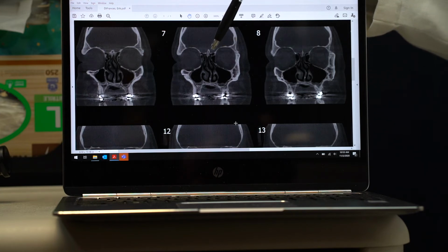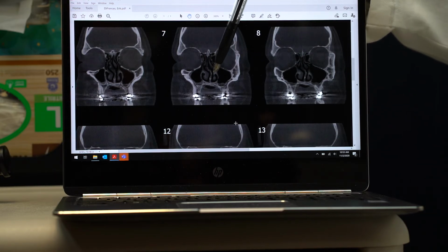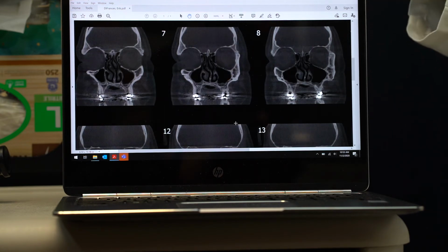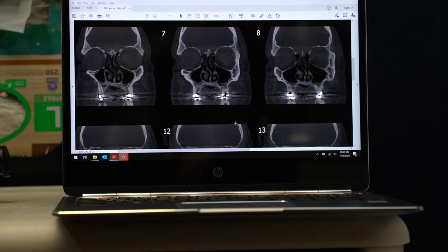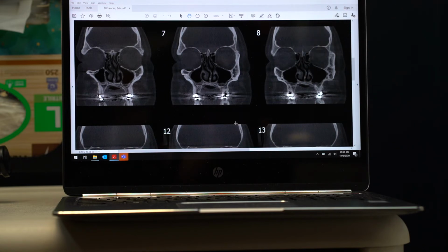As we go further back in, same story, the septum's still bent. Turbinates now we're starting to see are a little bit bigger than they ideally ought to be, so the breathing spaces are tight. Again, we start seeing that inflammation within the lining of the sinuses in the cheeks, and we also see some of that in the sinuses between the eyes. As we go further back in, same story. The septum at this point leans side to side, turbinates are still big.